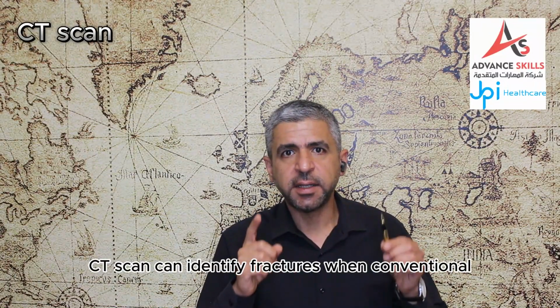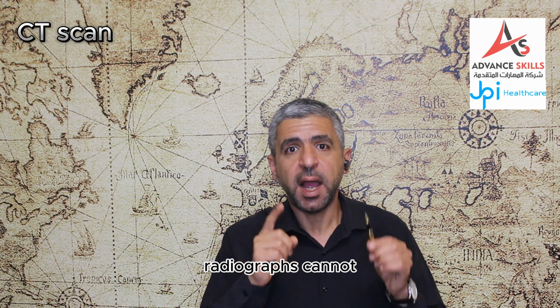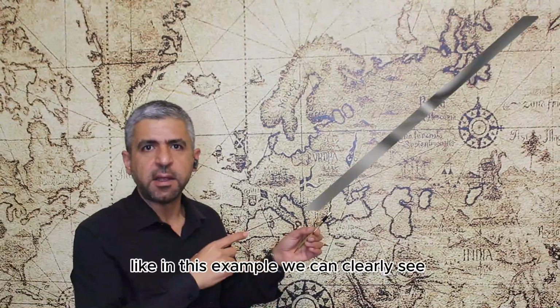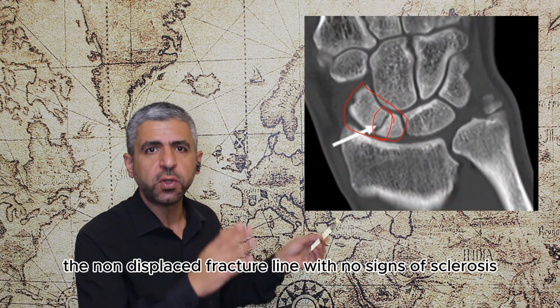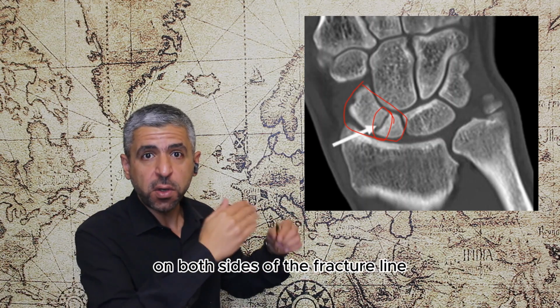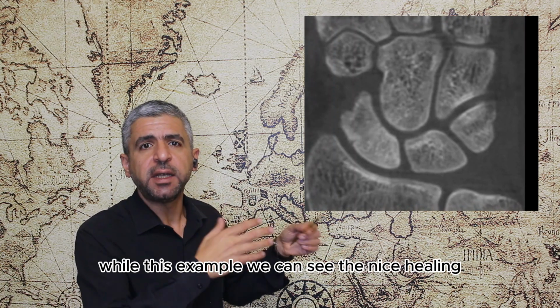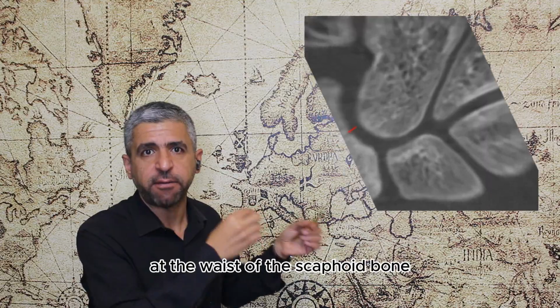CT scan can identify fractures when conventional radiographs cannot, and it's most commonly used for fracture healing assessment. Like in this example, we can clearly see the non-displaced fracture line with no signs of sclerosis on both sides of the fracture line. While in this example, we can see the nice healing and union of the fracture line at the waist of the scaphoid bone.